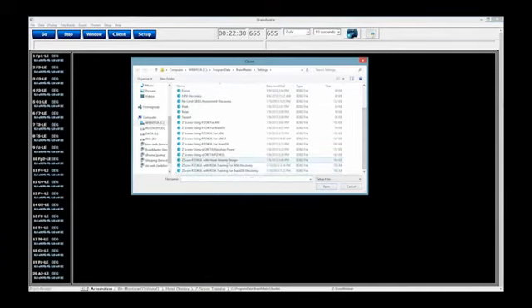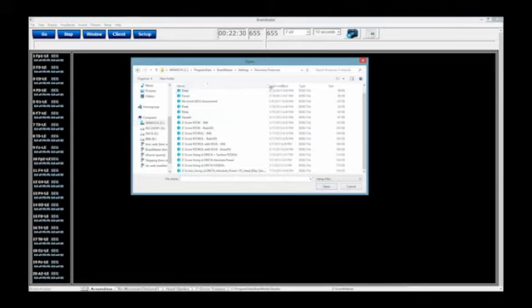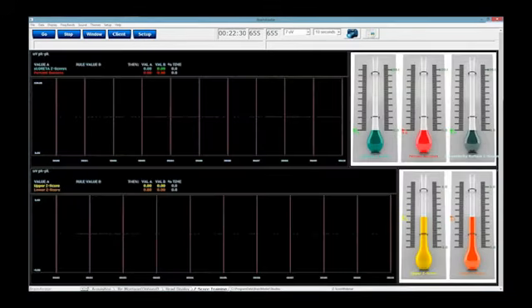And that is maybe on here. Let's go to Discovery Protocols. Let's see. There it is. ZScore is using sLORETA plus Surface PZOKUL. So I'm going to double click that. Once again, not much of a difference right here.